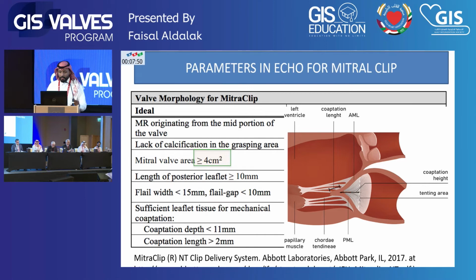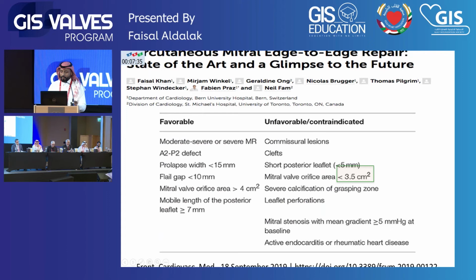So, of course, I'm not going to go through details. Definitely the next speaker will talk about this. But the most important thing is looking at the area and looking at the mitral valve coaptation here. There are a few numbers we have to measure before we go on and decide on a mitral clip.